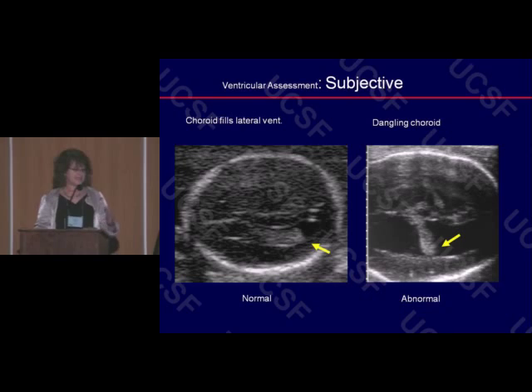It's expected ventriculomegaly will be detected. Once detected, a measurement is used. Again, like I said, with fluid assessment, trust your eyes, trust your subjective assessment. You've seen a lot of obstetrical sonograms. If it looks normal, it probably is, and if it looks abnormal, pursue it, chase it, and measure it.